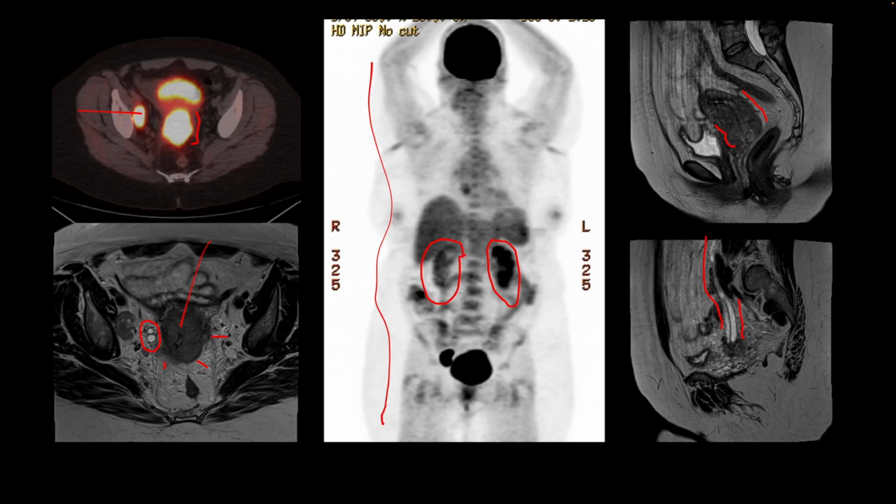And the function of the right kidney is compromised because there is hydronephrosis, and the hydronephrosis is because the distal ureter close to the UVJ is affected by or infiltrated by the cervical tumor. And that is a very common thing when young females present with hydronephrosis, unilateral or bilateral. The most common reason is an advanced or a locally advanced cervical tumor.